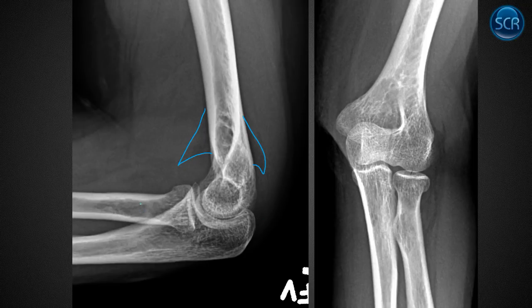In the context of trauma, it's probably a radial head fracture. And in this case, we can see that radial head fracture right here. That's a bad arrow. That's a little divot in the radial head, this line. I'm going to cover it up with my blue line. So you can put a chisel on there. I'm going to draw a little chisel here, right? And you just went tink right in the radial head, and that causes a big joint effusion. So that's the most common cause of a joint effusion in trauma in the elbow in an adult.